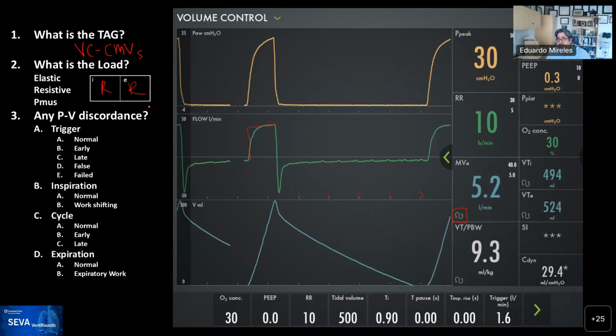All that is the patient circuit discharging its compressed volume. Now, patient circuits have compliances somewhere around 2 or 3 milliliters per centimeter of water, and you multiply that by 30 centimeters of water, so you got almost 100 mLs that's going to get expressed out there immediately at a very high flow, and that's why you see that funny looking curve.